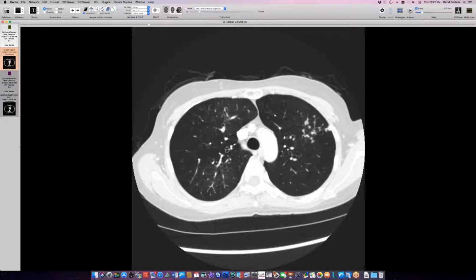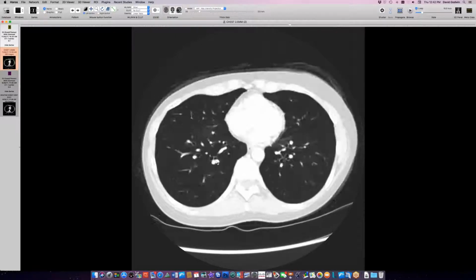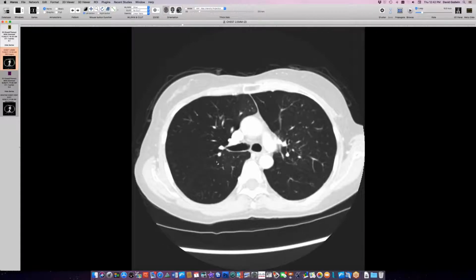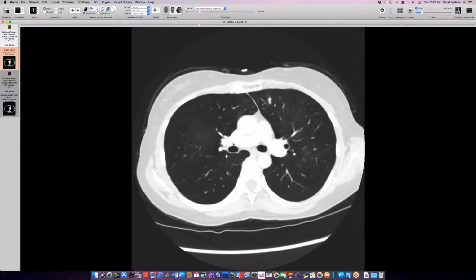I could look for sternotomy wires too, and that will give it away. Yeah, the central airways look irregular. I think you're right. I think it was a lung transplant person. I think I saw some sternotomy wires down there too.